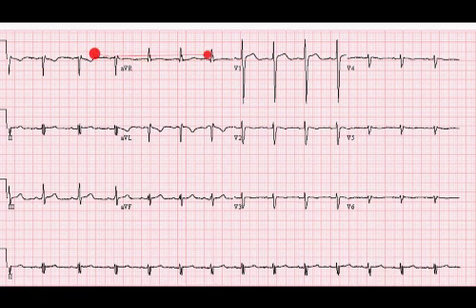All right, I hope this is not another example of lead reversal. Once again, we're looking at lead P wave down, QRS down, and T wave down in lead 1. And as I said a few minutes ago, this can be situs inversus. I'm looking now at the chest leads, and they show exactly what you would see with situs inversus.